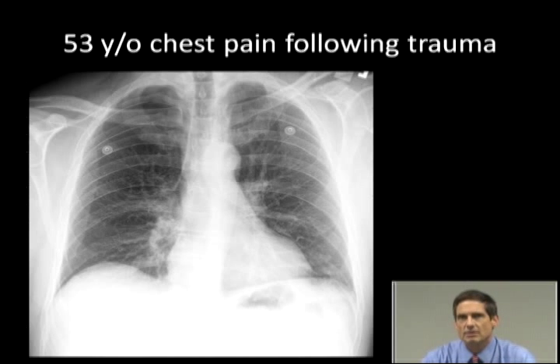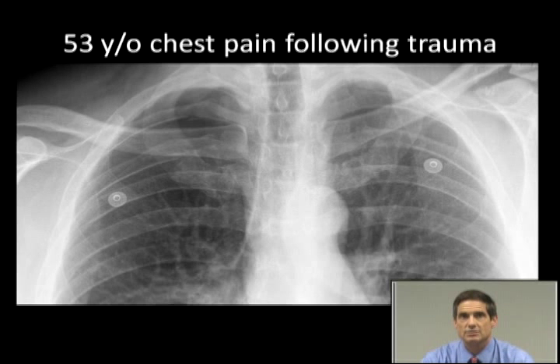Here we have a 53-year-old who had pain after trauma. And again, although this lecture is on cough, dyspnea, and pulmonary nodules, this patient did have some dyspnea along with his pain and trauma history. And this is a standard chest x-ray.